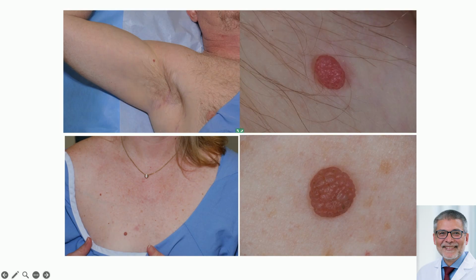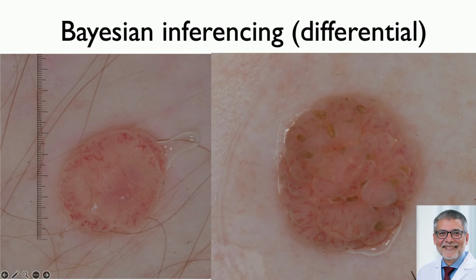So what's the harm? You put your scope on it. What do you expect to see? Some globules, some tan pigmentation, some hypopigmented areas, maybe some comma vessels, right? Easy. A millisecond for you to know whether it's a nevus or not. And then you take a look at the two. The one on the right is a classic intradermal nevus, a mammillated surface, comma vessels. It has some comedo-like openings. The one on the left, not at all. It has none of the features of an intradermal nevus.